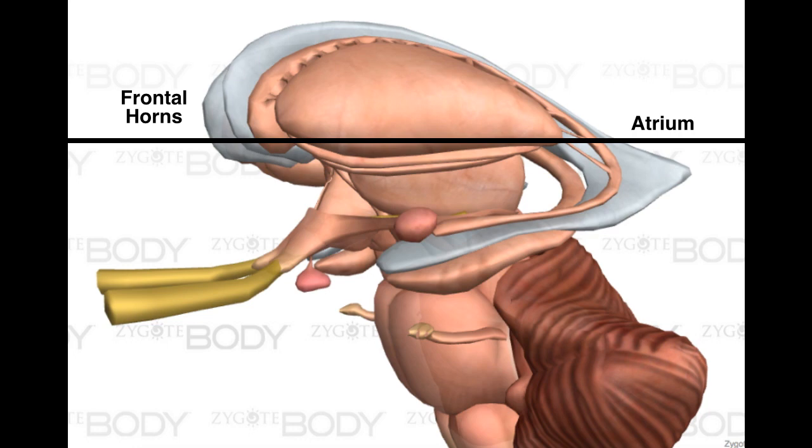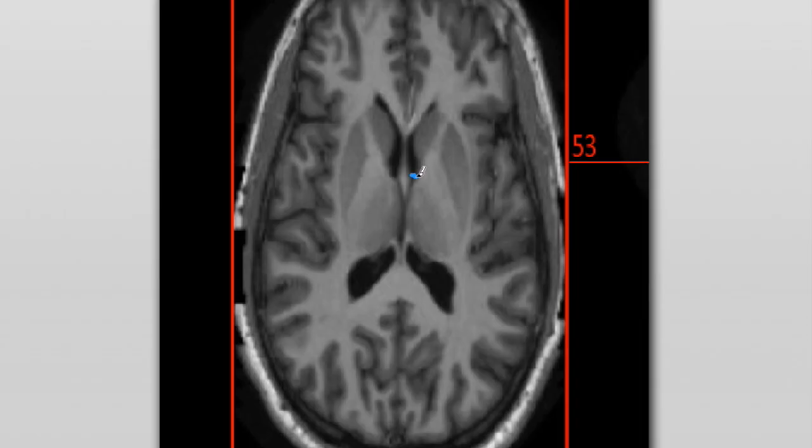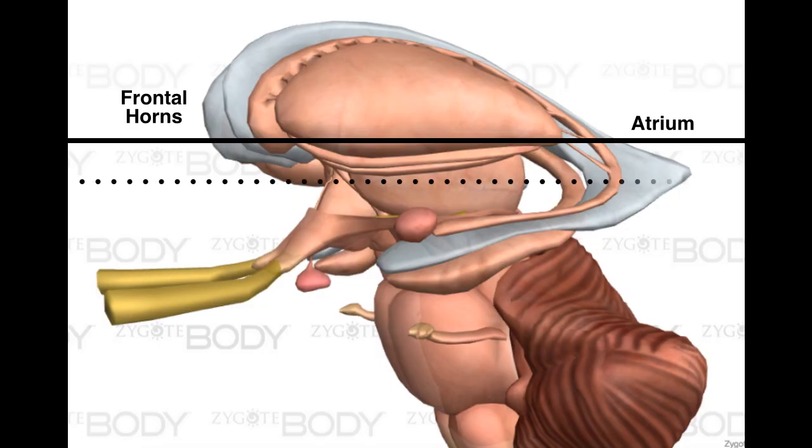As you can see, the frontal horns end just below this level and won't be seen on imaging. So if that typical butterfly shape is seen, the image must have been taken from this level or near it, because it's cutting through those 2 superior aspects, the frontal horns and the trigone, which the frontal horns are not found at the level below.